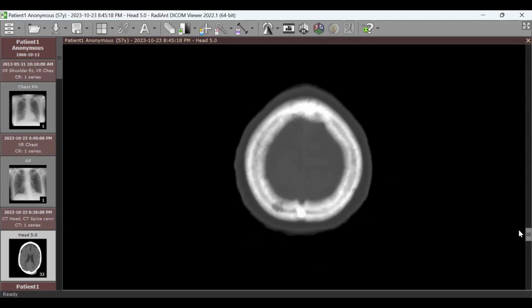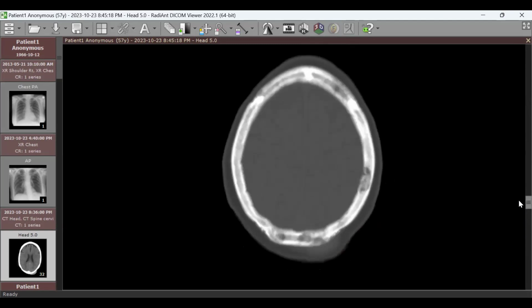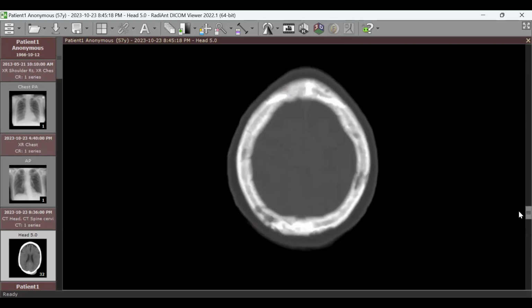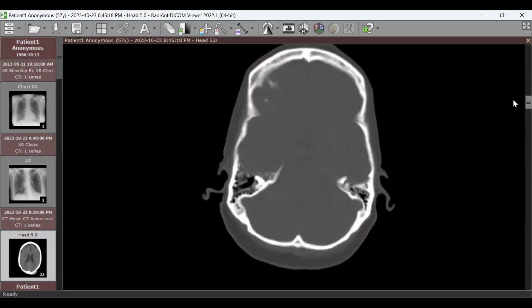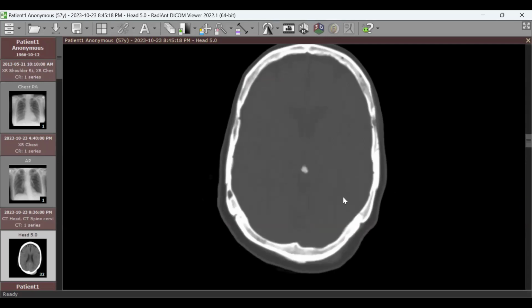Okay, there is a left occipital hyperdense hematoma, a subgaleal hematoma, and there are multiple lytic lesions within the cranium, of variable size, distributed randomly. Perfect. So what do you think? According to the history of hypercalcemia and multiple lytic lesions, it may be a case of hyperparathyroidism.